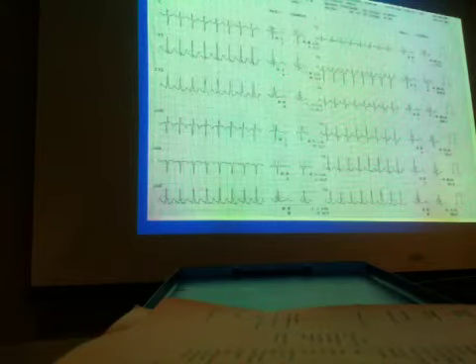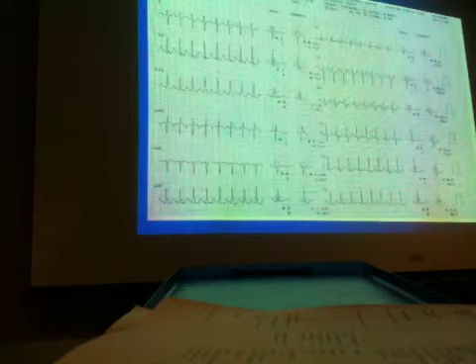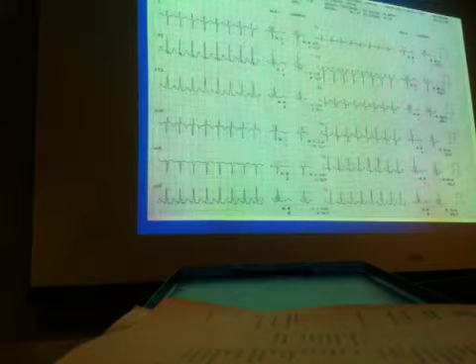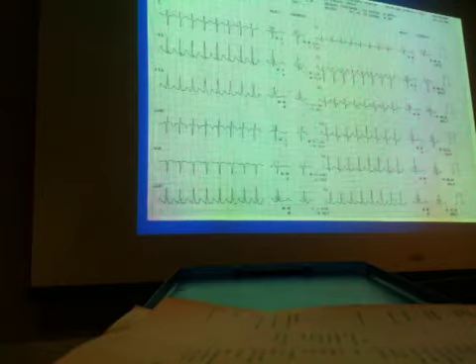Okay. So I'm not exactly sure, but this has to come from above the ventricle because our QRS is nice and narrow. It's almost one up and down line. You'll see in a bit when we have ventricular rhythms, the QRS becomes really broad and wide. So a narrow complex tachycardia, which is what this is. Okay, but we don't exactly know what's underneath.